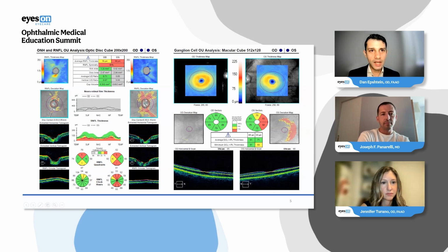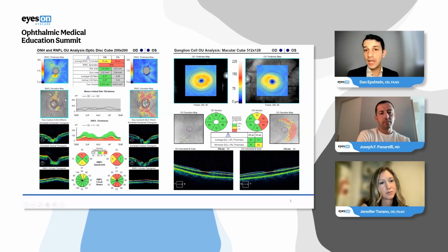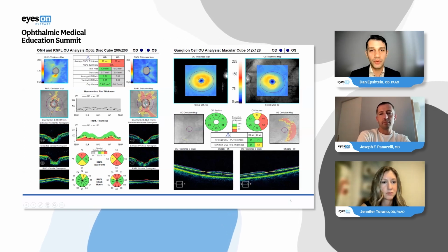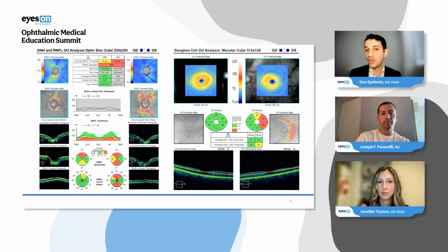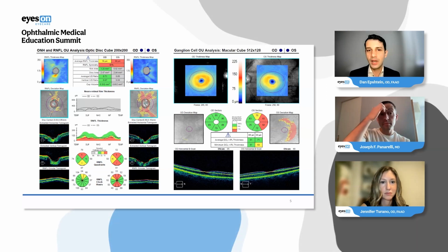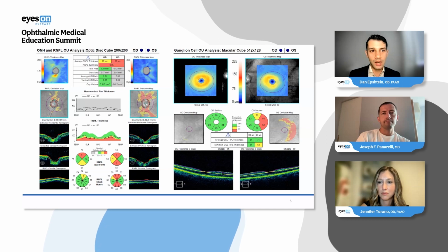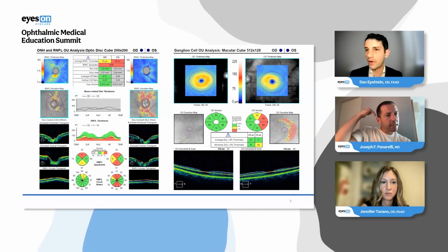So with the right eye, I would say he has mild thinning, more so in that superior hemisphere here. For me, it does worry me because we know how it could turn out with the disease in the left eye. So chances are, if we just leave him at this point with no treatment at all, the right eye would worsen. But thankfully, it seems like it was pretty stabilized with just latanoprost in the right eye. So I'm worried that we have to monitor him, but not worried that he's progressing too much in that right eye.